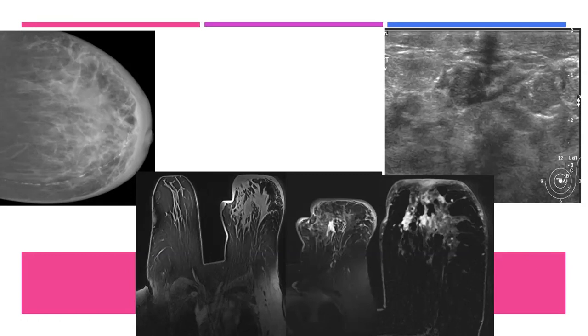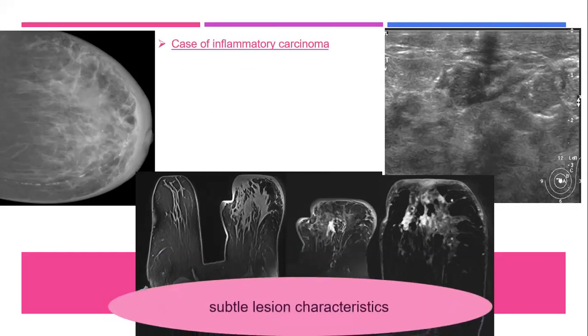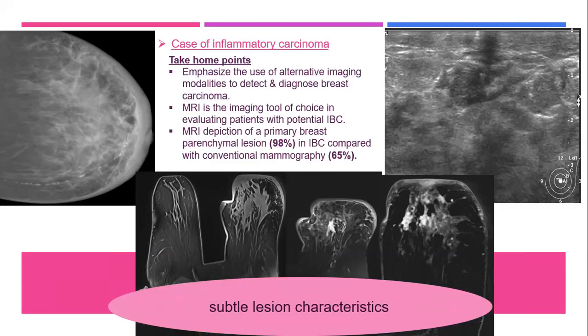These are suspicious for inflammatory breast carcinoma. Lymphatic spread into the skin, and the case was inflammatory carcinoma. So on mammography, we cannot decide if it is a systemic cause, especially if the patient is old. We cannot decide whether the edema is due to cancer or a systemic cause, okay? Or lymphatic obstruction in the axilla or whatever. A lot of differentials, because the only presentation is edema without detectable masses or suspicious calcification.